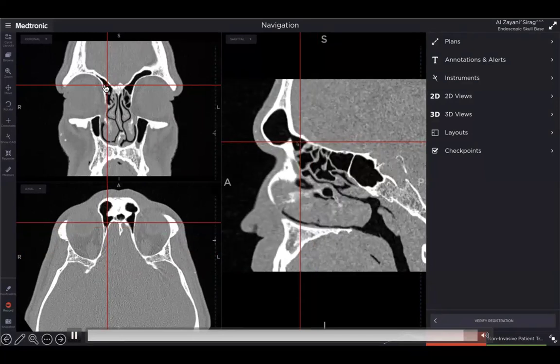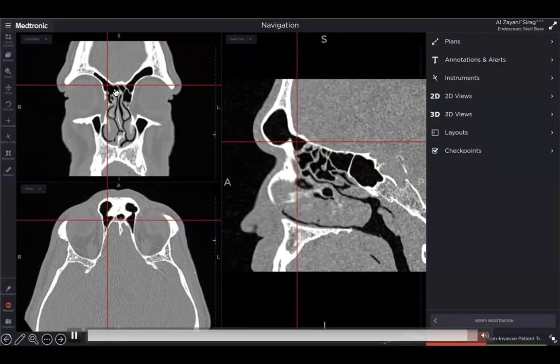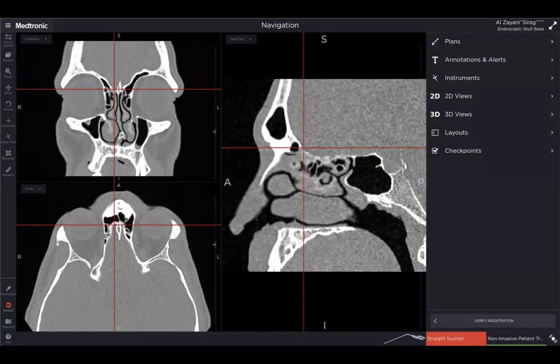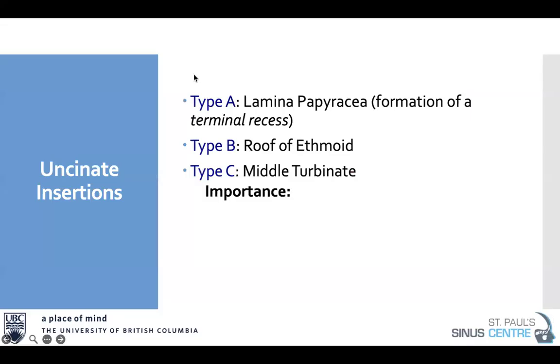But that frontal sinus on the right side actually has pneumatization right there. And that's what you could call an intersinus septal cell or intersinus frontal cell because it drains into the right frontal sinus. So I hope that wasn't too confusing. So let's go through all of those things in a bit more granular way so we can break it down a bit.